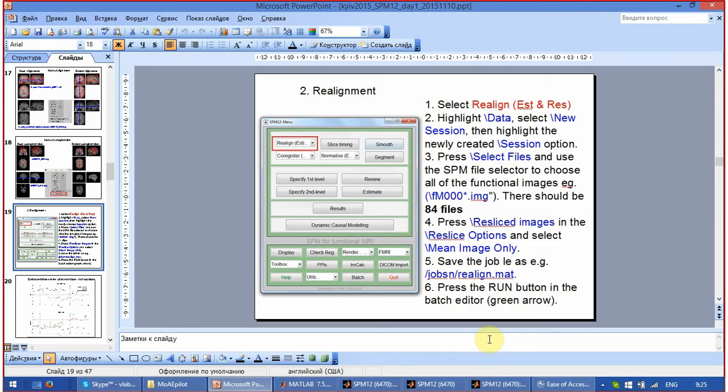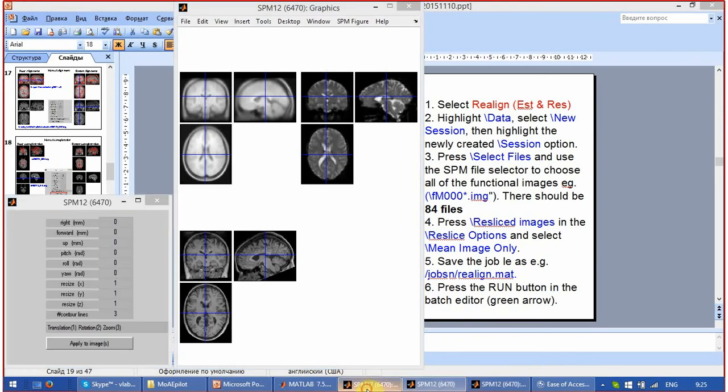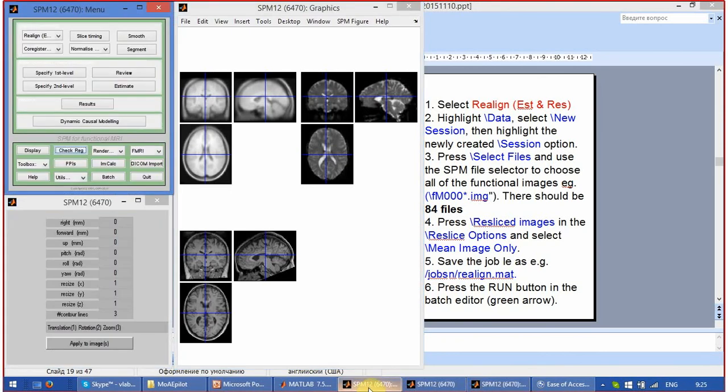What is reslicing and why is it important to keep in mind if you reslice or not? Reslice, unlike reorient, is going to change your data. It is going to interpolate reoriented data so that the planes of acquisition are parallel to the horizontal plane.